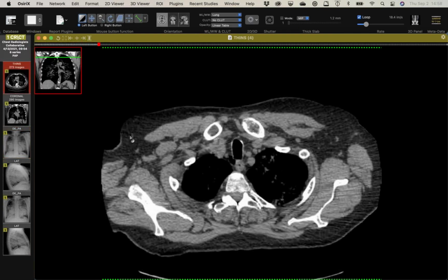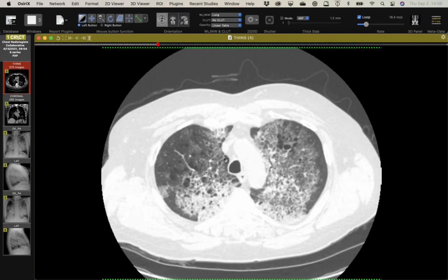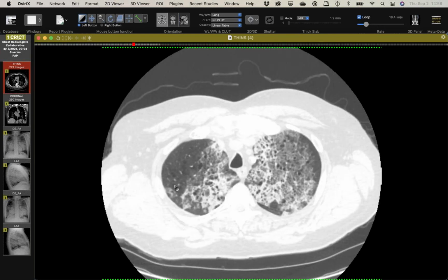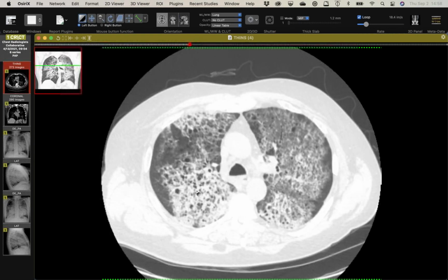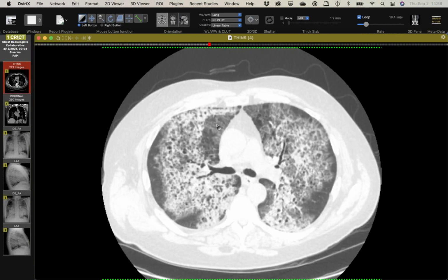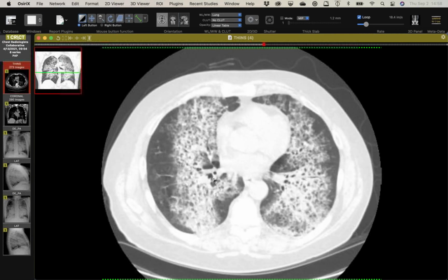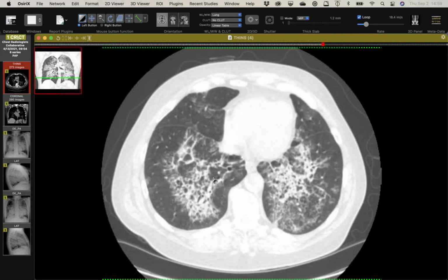And then this was the CT scan, and we have a lot of ground glass and consolidation. In those areas of density are these lucent cystic spaces. If you look up here, there's a little bit of emphysema, but as we go down, the holes in the lung seem to be confined to areas of abnormal lung. There are a few areas that are maybe a little crazy paving-like, but it's very, very dense. No effusions, no lymphadenopathy, and that peripheral sparing persists throughout.